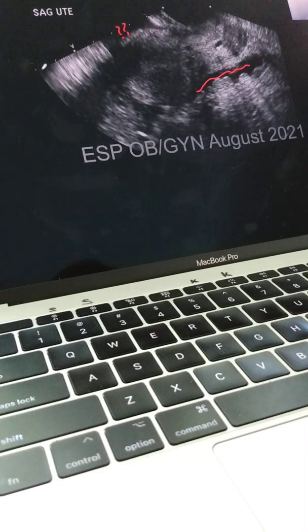Okay, and not many of you. There are 2 people that raised their hand. So the rest of you did not raise your hand. So put in the chat what you think that is. Some of you are getting to know me well where you already have it in there. Yeah, very good. That's the urinary bladder.